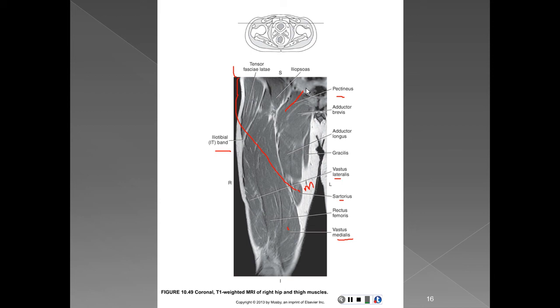As a matter of fact, sometimes when you take an X-ray, you'll see a real ragged looking ischial bone of the pelvis. That's because of calcifications and arthritis and just pulling of the bones, including the hamstrings and the quads, on the ischium. One of the indentations is from the pectineus muscle.